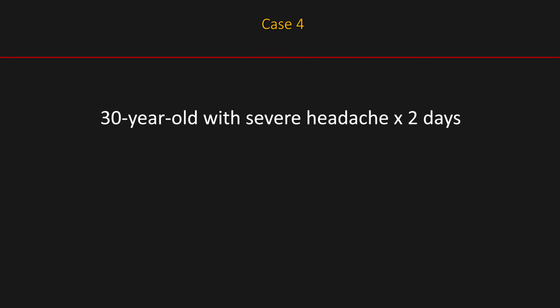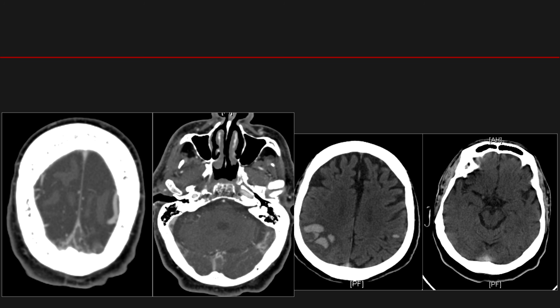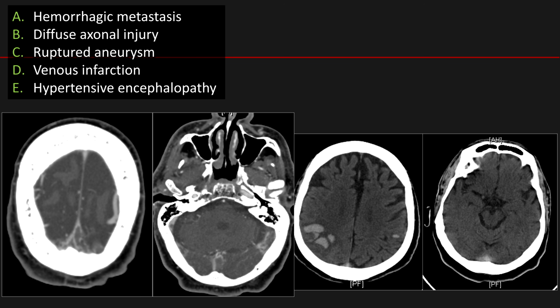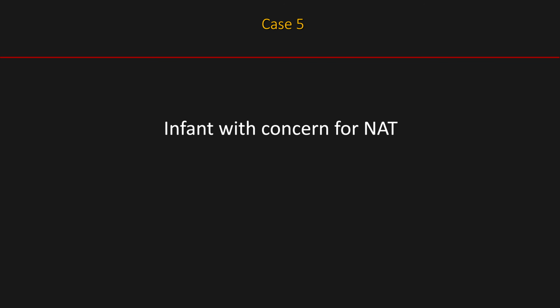Case 4. Non-contrast CT first, followed by this contrast exam. Answer is venous infarction. Case 5.